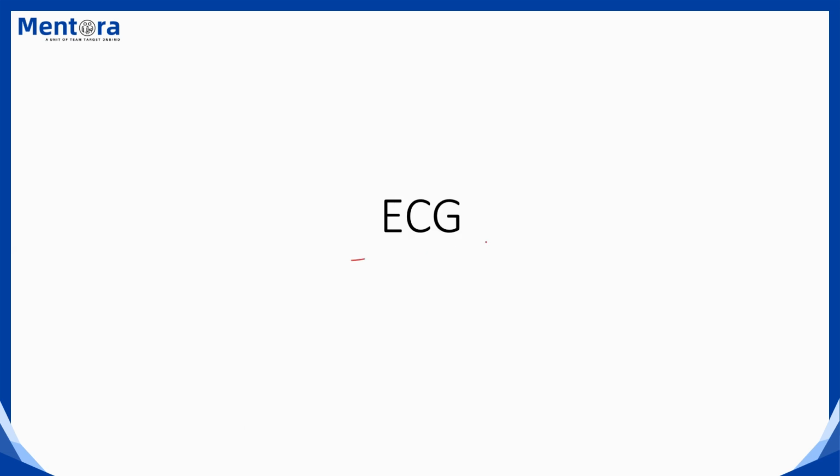We are going to start the basics of ECG, just only 10 minutes, then we can go for the tachyarrhythmias. So in the first basics of ECG, we should know very small basic. What is small box and large box? There are two boxes we know.